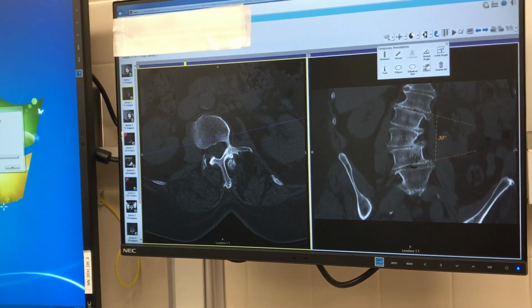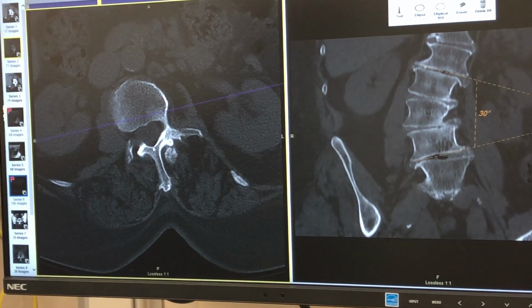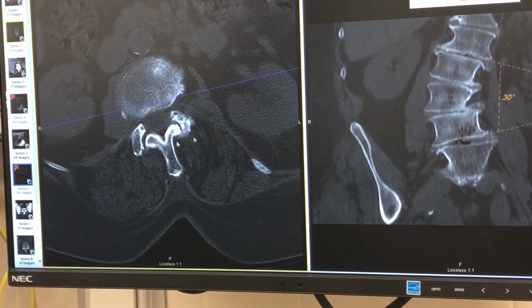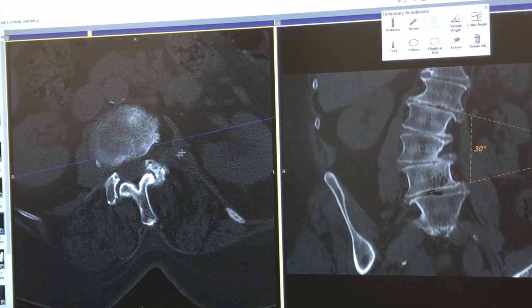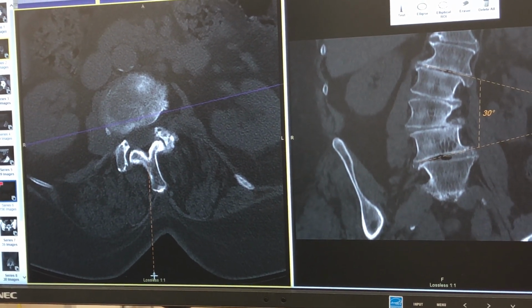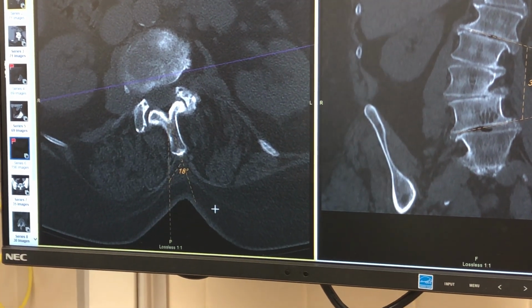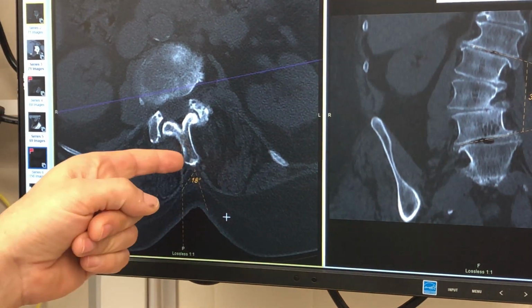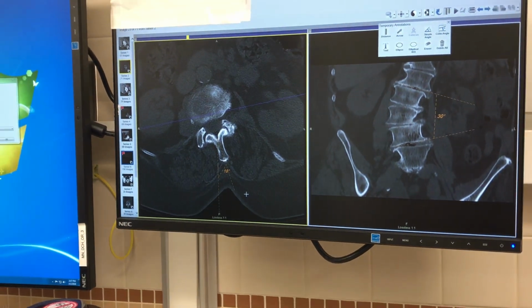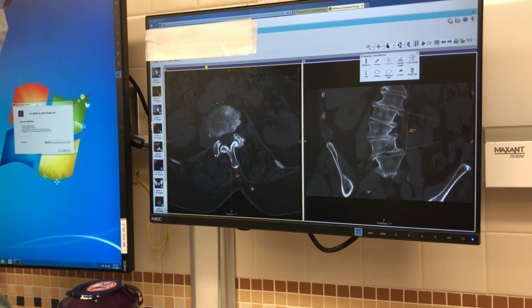And the way to measure that, you can use, again, the Cobb angle. So you go from that divot here, you find that divot, which is easy to find here. You measure from here straight down, one angle, and then from the same place to the end of that. Like here's 18 degree torsion, and the spinous process to the left. That changes a lot. That's extremely important information for how to angle the screw when we are putting the pedicle screw.